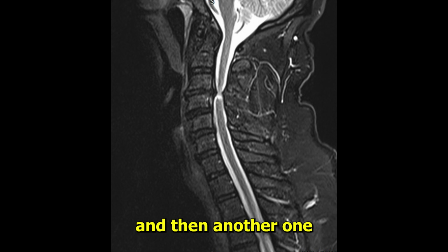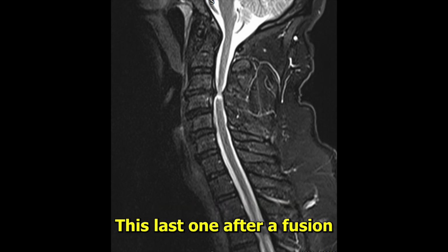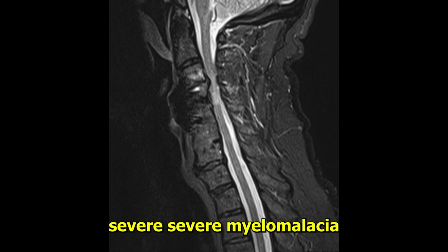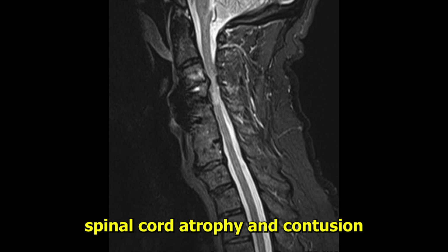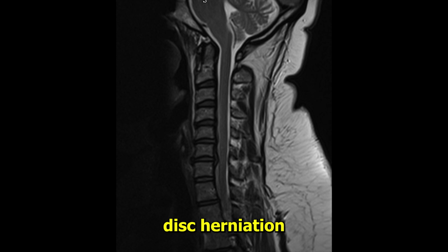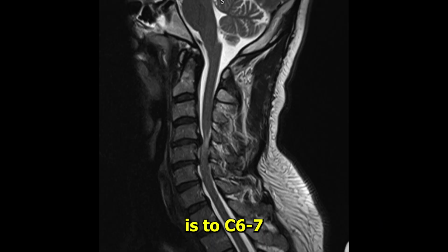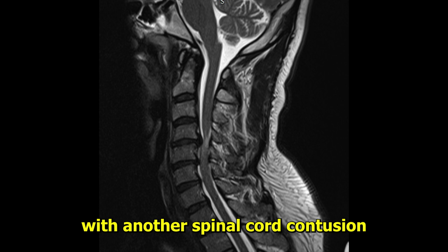And then another one with two more with spinal contusions. This last one after a fusion. Severe myelomalacia, spinal cord atrophy and contusion. And here's another one that's sort of a fairly new disc herniation. It's C6-7, a large broad-based bulge of the disc. And then another one is C4-5 with another spinal cord contusion.